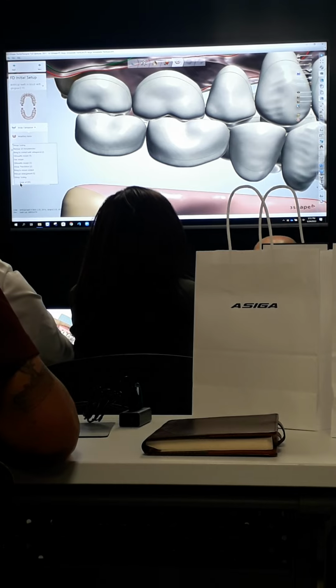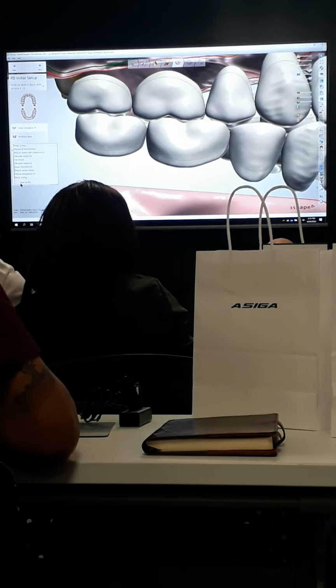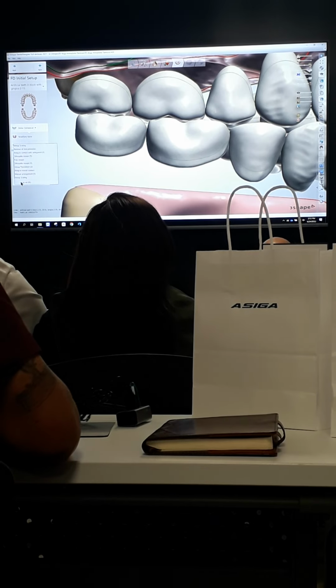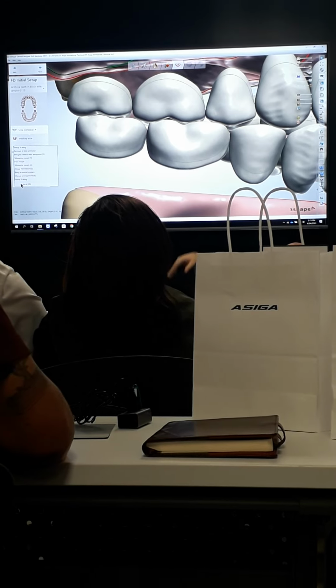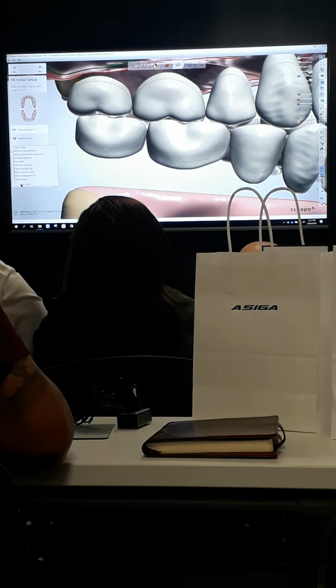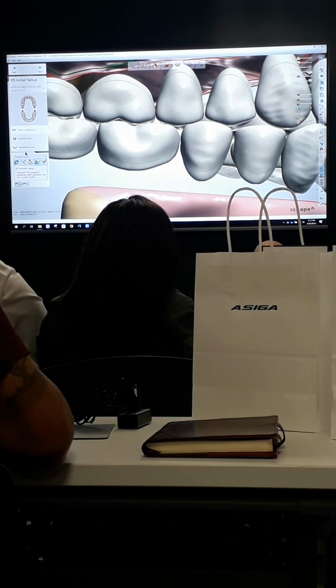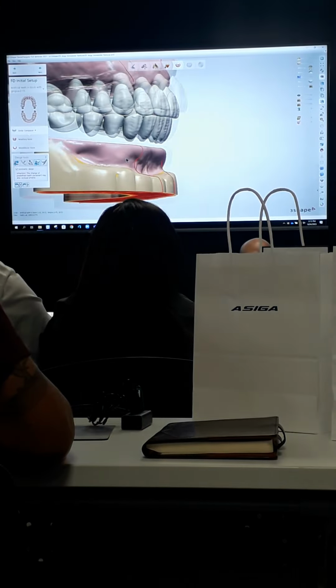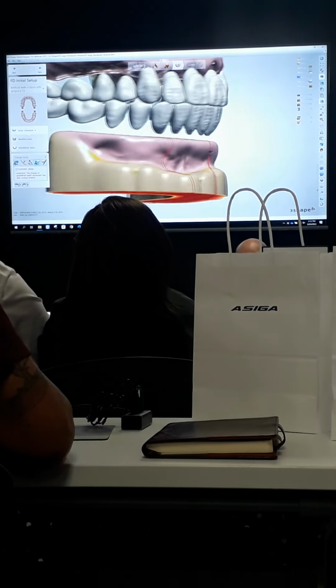And you can see when I go down here to the undo button, you'll notice that next to the undo button there's a drop down arrow right here. And what this is, it's a listing in order of the last tools that you've used. So I can see the second one down there is remove all second premolars. So if I just click on that, it'll undo everything that I did after that and that step. So you don't have to sit there and just click the undo button over and over again until you get the tooth back.